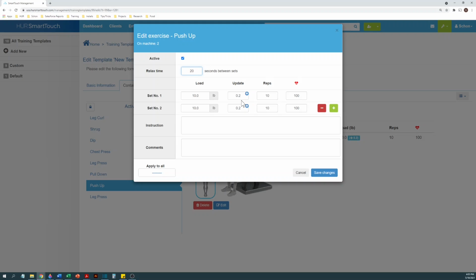This is one of the most incredible features HUR has to offer, so you will want to take your time here and understand it, and know that we are always available to answer questions. To set the update condition, click the blue button with the up arrow.